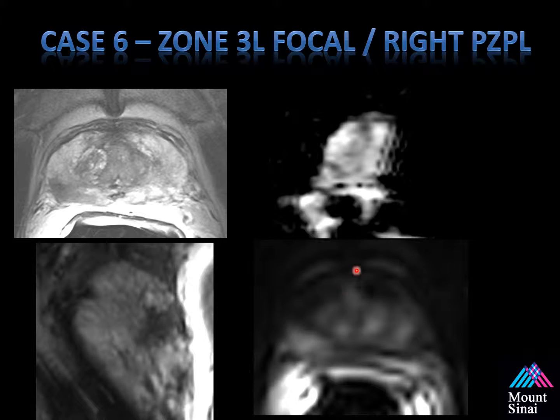Now, what is going on over here? Why is there this abnormality located? For some reason, there's some warping or changing of the ADC map. Well, there's still some restriction, but the patient does have a left hip replacement, which can affect the images that are obtained.